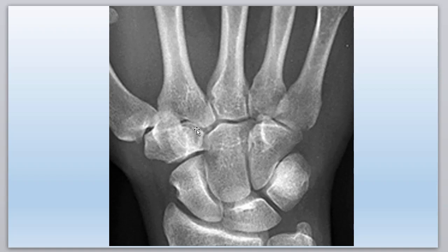And then we have another little bone, the trapezoid bone, right in here, not too well seen in this image. Okay, next is the captain of all the carpals, the capitate bone, and then we have the hamate right here. Another big projection right here. You can see the density. That's the hook of the hamate. So the pisiform, the hook of the hamate, and the two tubercles here of the scaphoid and the trapezium, that kind of forms the lateral walls of the carpal tunnel.